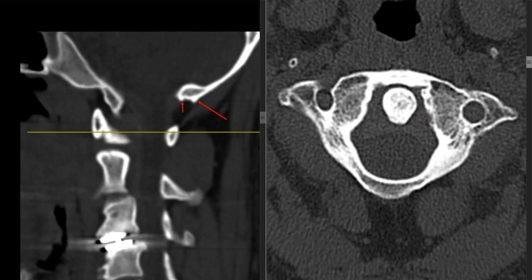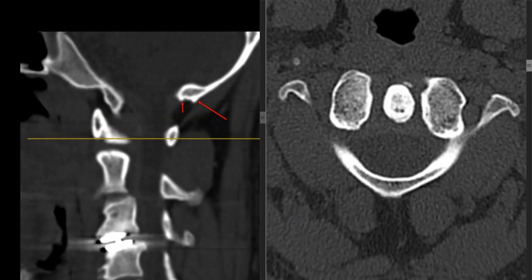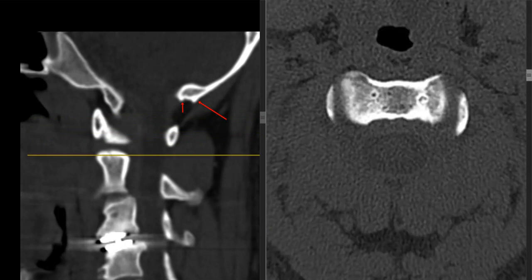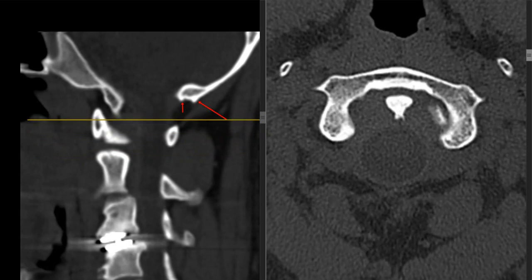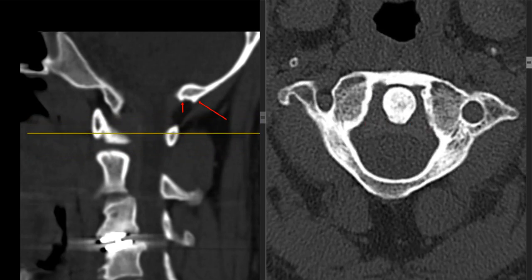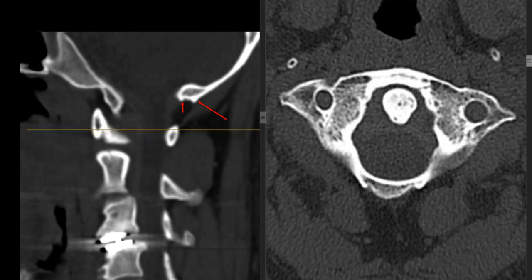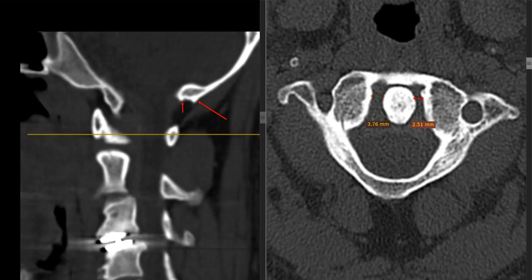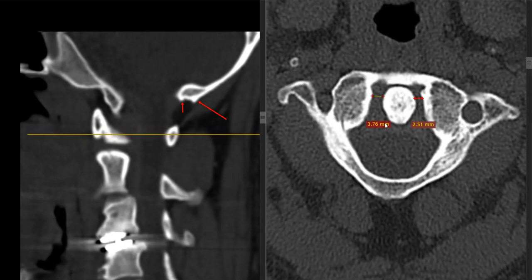Now this could be where your damage is to the transverse, or no, it wouldn't be the transverse. This would be more right around here where you would see it. It might not be anything major, and even this slight deviation is not really much to talk about.